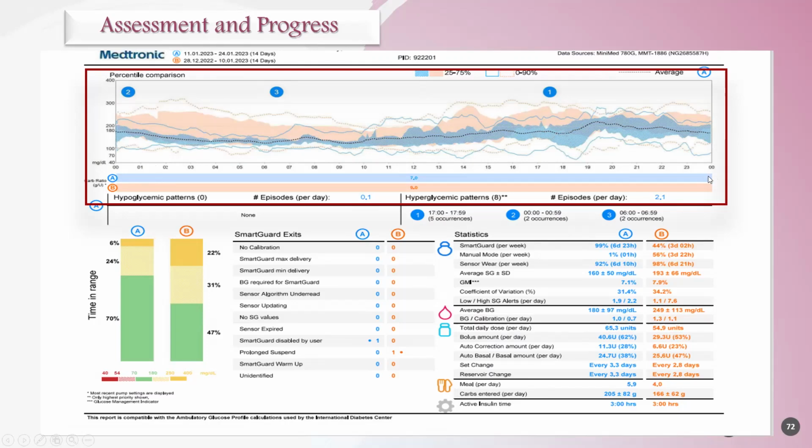This is the interquartile range, and the other, fading one, this line and this line, the interdecile range, means 90% of the readings were around these groups. But as we said, most of the time we take care about the interquartile range, this one. That means 50% of his readings for the last 12 to 14 days will go through this blue shape. Okay, so very clearly from the comparison between the two lines, this patient had improved.